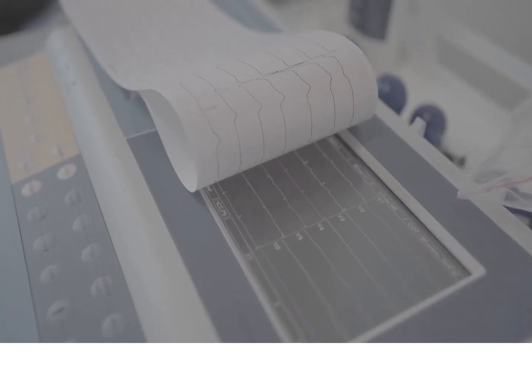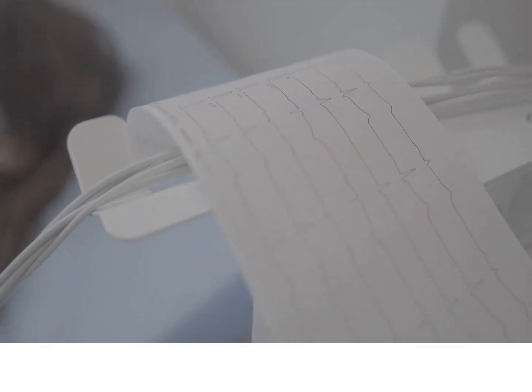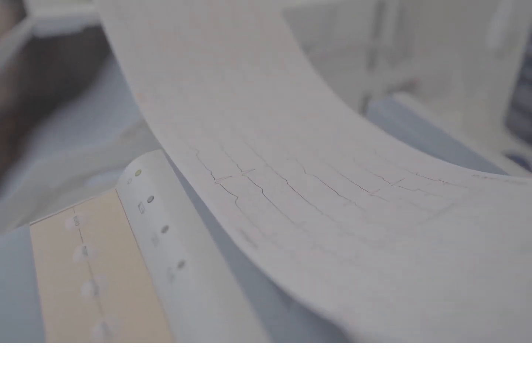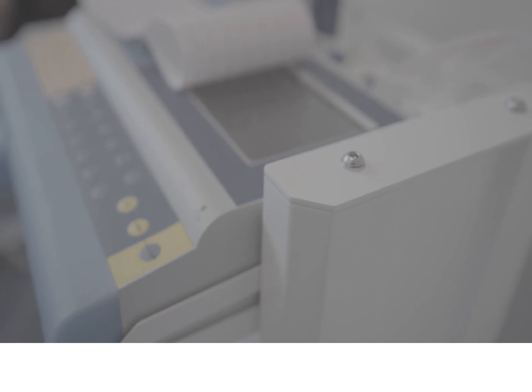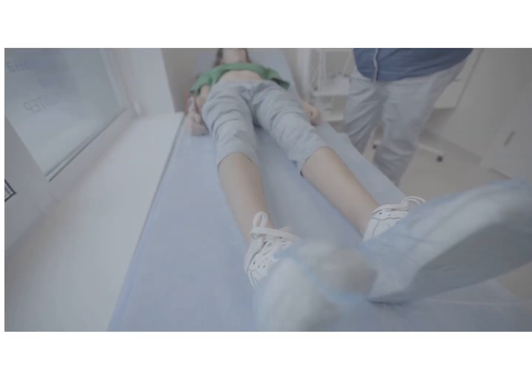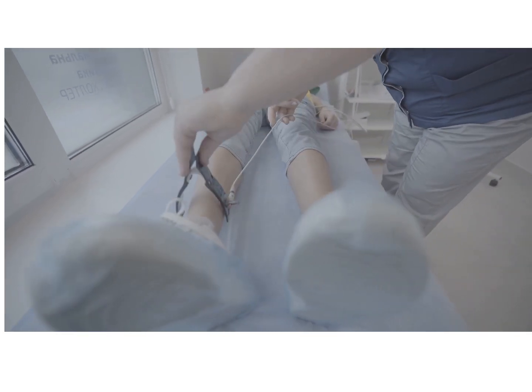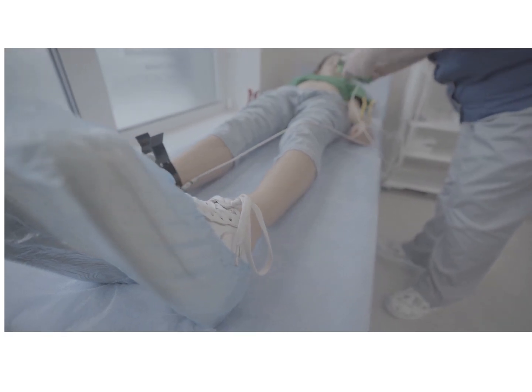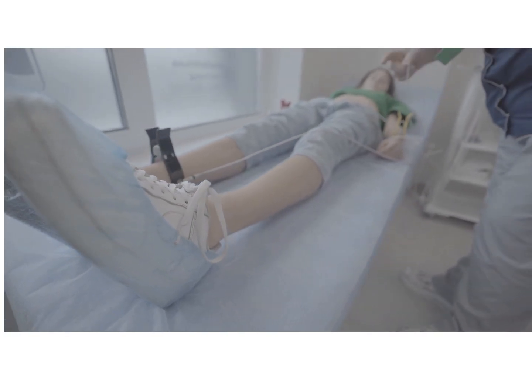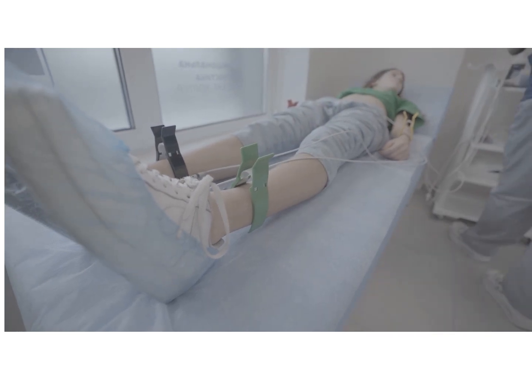The ECG is a diagnostic tool that captures the heart's electrical activity. The heart's conduction system, consisting of specialized cells, generates and transmits electrical signals to coordinate the heartbeat. A 12-lead ECG records the electrical activity of the heart from different leads. The placement involves attaching electrodes to specific locations on the body to capture electrical signals from different angles.